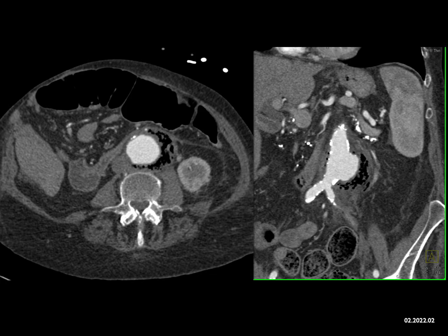So what's the best diagnosis? Well, it is an aortic aneurysm. I can't argue about that. It's not really a dissection. It's an aneurysm with a big ulceration, and you can see that's a good choice as well. But the best diagnosis is aortoenteric fistula.